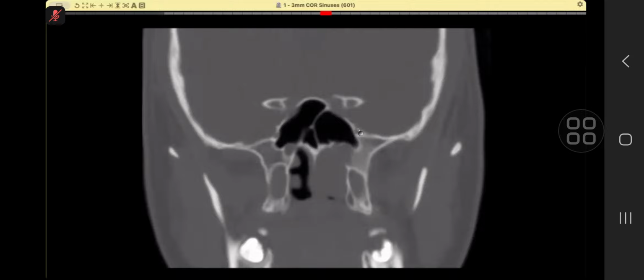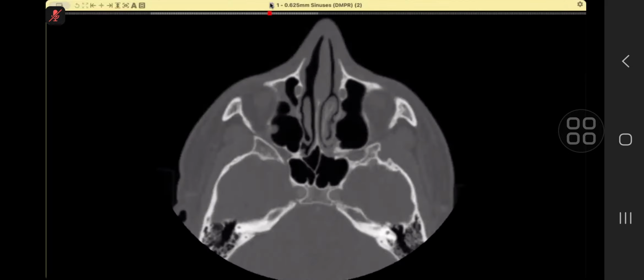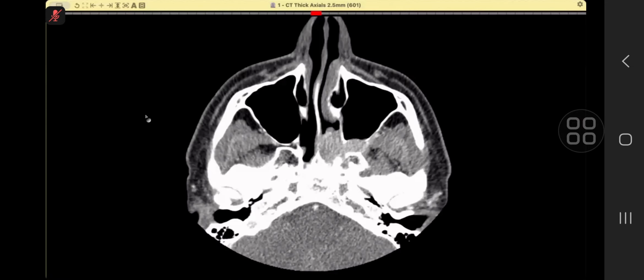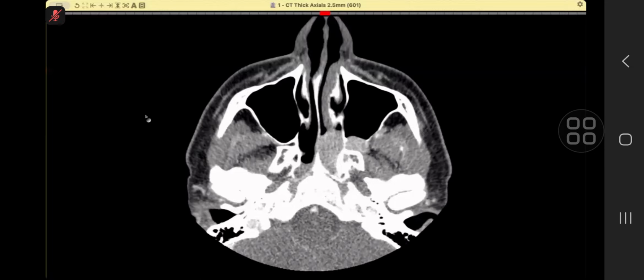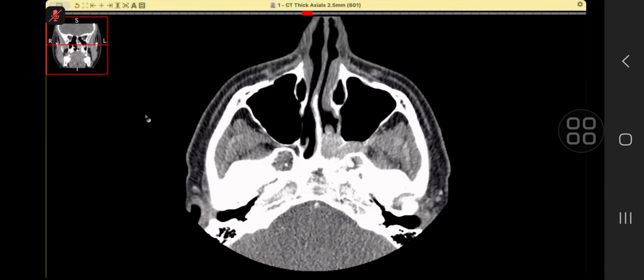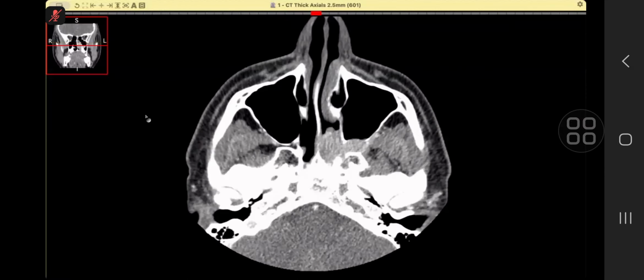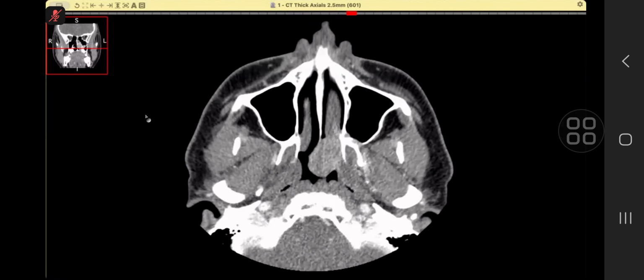So what is your conclusion? Sir, I want to look at the post-contrast images. However, on this window, considering a mass centered there and the history, I'm thinking of nasal angiofibroma, but I would like to confirm it. I could appreciate the mass centered in the pterygopalatine fossa, causing bowing of the posterior wall of the maxillary sinus anteriorly with extension into the nasal cavity.